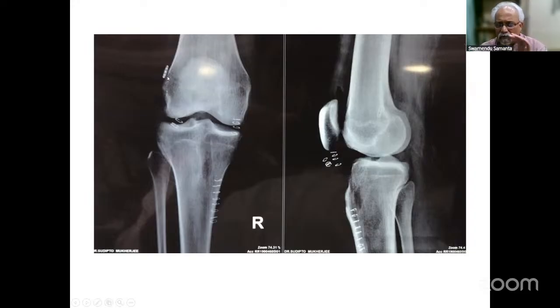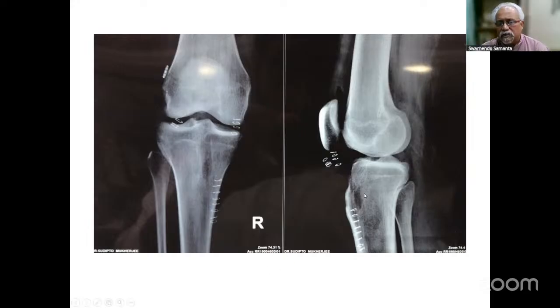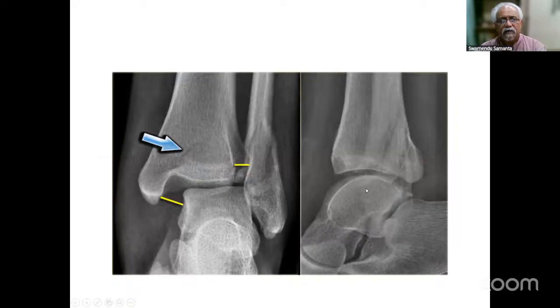So in your viva table also you will get the implants. Then the one simple question I will ask you, probably, is how the part of the graft in the tibial tunnel has been fixed. Sir, maybe with the bioabsorbable screw. Yes, maybe, because you don't see any button over here, you don't see any pillar and post technique here. This is radiolucent, so a bioabsorbable screw has been used. Okay, very good. Now we are going to another one.